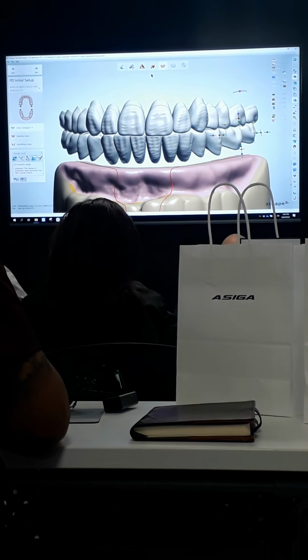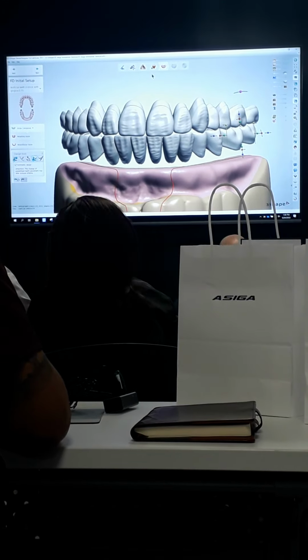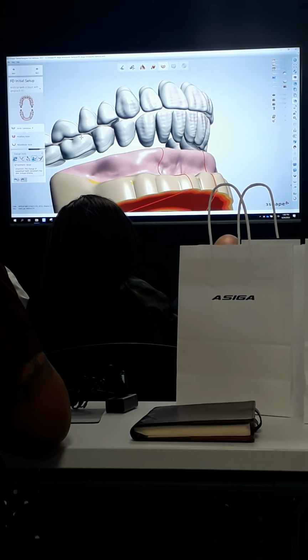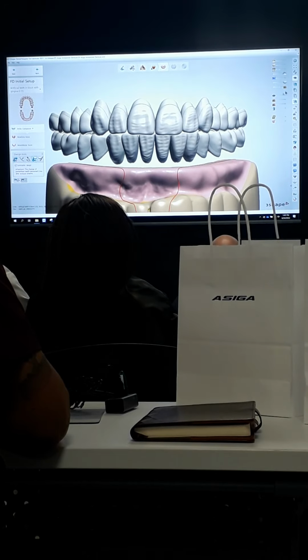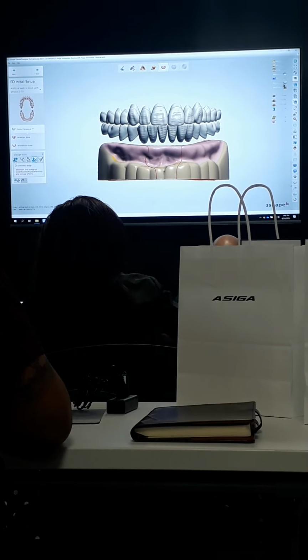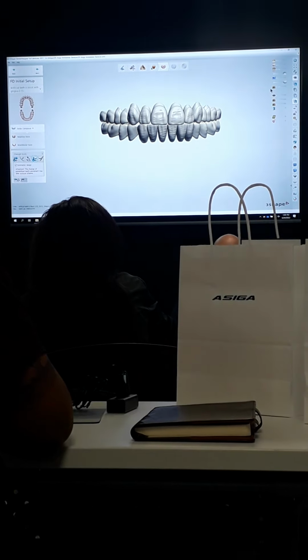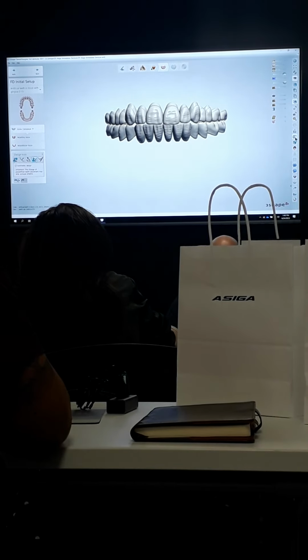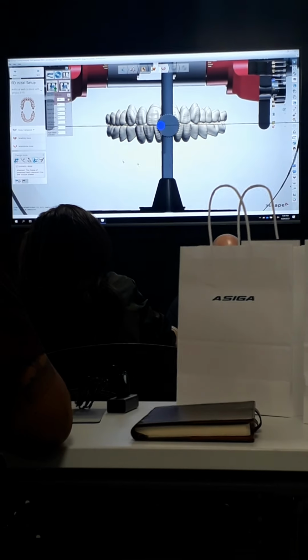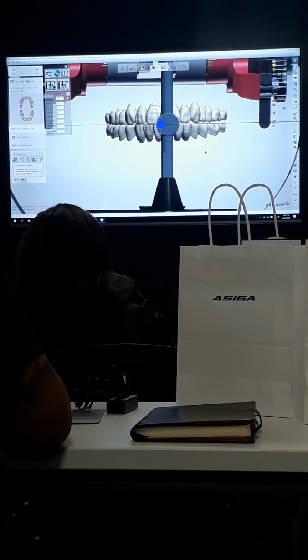So now let's say I've got my setup happy, I'm where I want to be. I haven't really changed anything back here in the posterior yet because I like the relationship of the teeth. So now what I need to check is the actual movements of the teeth. So usually I turn everything off but the teeth just so I can see things. And I'll go ahead and turn on the articulator. So the articulator icon is over here on the right. It's the one that looks like an articulator.